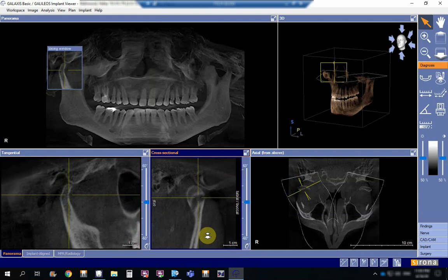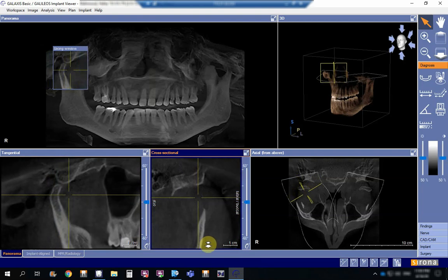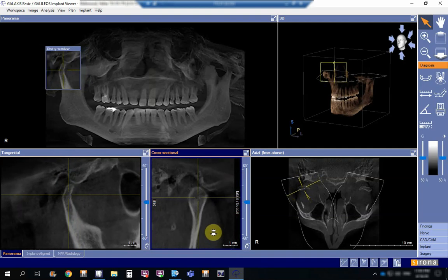Now I am done with the condyle. There is no more condyle over here. Then I'll go back in the middle. So actually the cross-sectional view, or the coronal view, moves the slices in a 0.3 millimeter anterior-posteriorly. This one has moved it in a medial-lateral direction. Okay, let's go to the axial view.